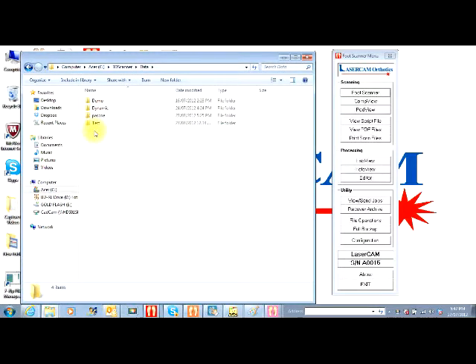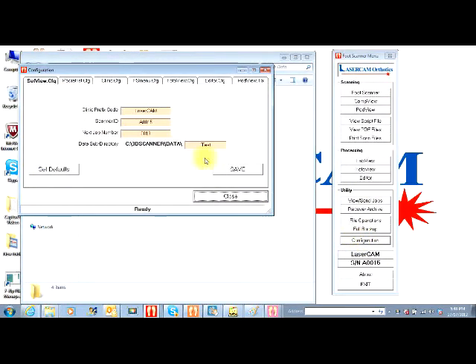Because we're a lab, it's a little bit different from a single user, but from a lab's point of view, I create a directory for everybody that's got a scanner, and when I install a scanner, I open up the configuration file and I name the scanner. If it's, say, from Ride Podiatry, it'll have Ride there. In this case here, it's the laser cam scanner. The serial number on it is 15, and the next job in sequence is 13.